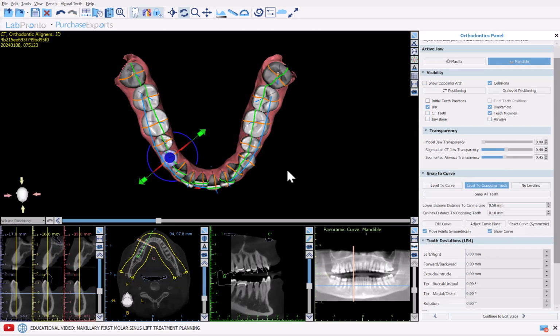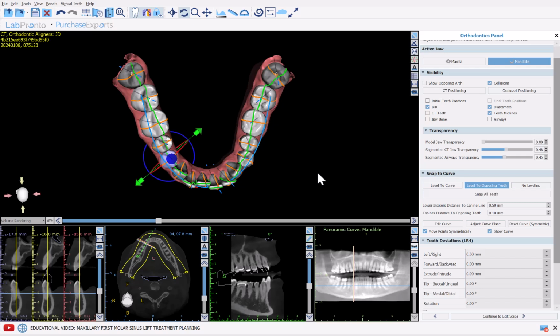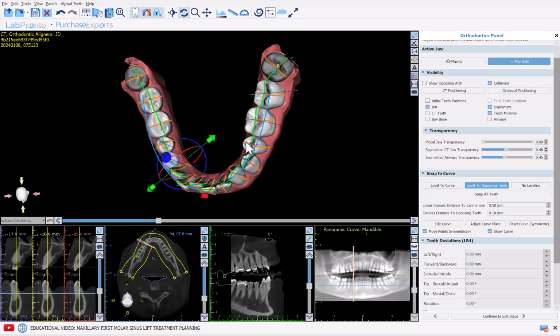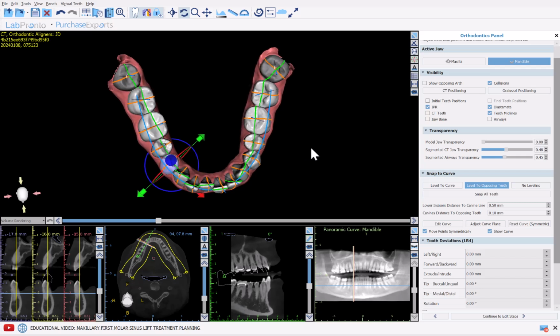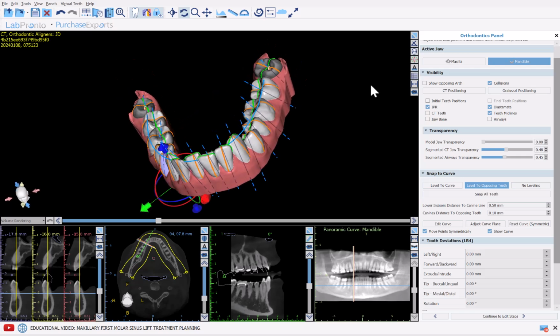We could see that the software presents a curve on top of the teeth, and this provides a quick and convenient way to generate an initial digital tooth setup, which you could then tweak afterwards. Before we discuss the different functionality of snapping the teeth, let's just discuss the functionality to edit the curve if needed. If you're happy with the curve placement, everything is fine.